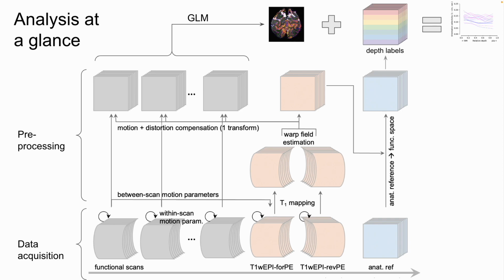I do some math to actually extract from the data a T1 map, which has really lovely gray matter, white matter contrast, which is what we're always going for in life. Then I feed those into the algorithm. I'm using AFNI's Q-warp. Same thing as FSL's top-up, same as BrainVoyager's top-up, probably: forward and reverse phase encode scans to discover the truth in the middle and estimate a warp field.